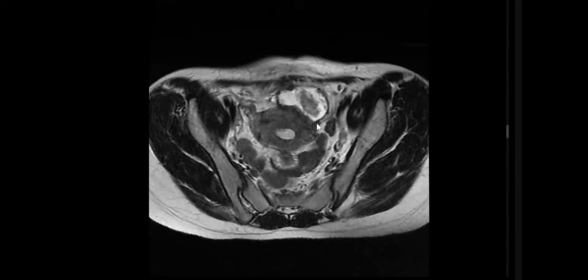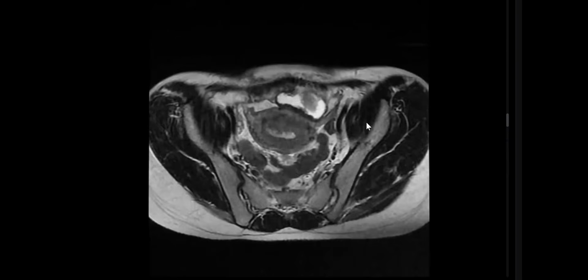You said contained perforation, as dehiscence. Do you see any defect, any continuity? No, sir, not in these images. Good, good. This is the value of the sagittal. So, collection. Can you name this collection?